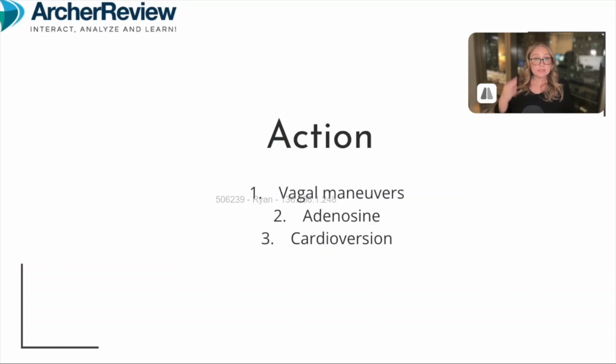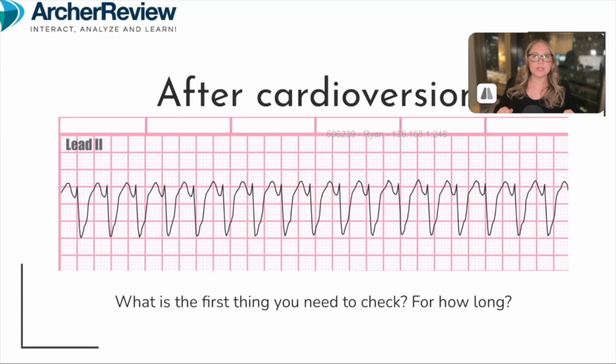That doesn't work. Step 3 is synchronized cardioversion. This client has a pulse, so we need to cardiovert. And that's what we're going to do to this client. Let's say we tried our adenosine, it didn't work, so we decided to cardiovert. Let's check our EKG again. After cardioversion, this is what we see.